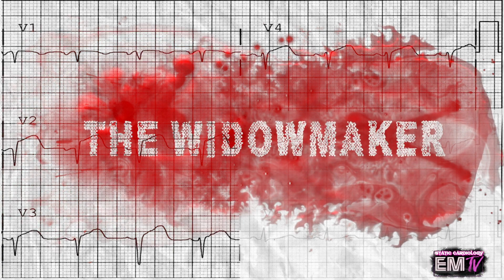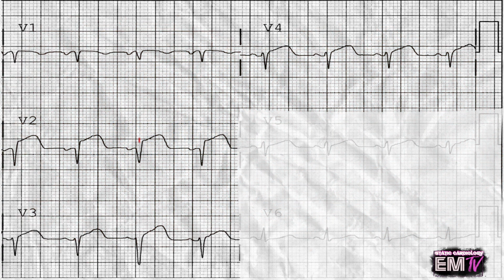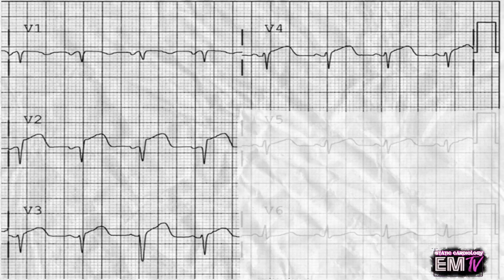In this lead grouping, I'm seeing significant ST segment elevation in multiple leads. V2, which can also be categorized as a septal lead, V3, and some in V4. I would have already met enough criteria to declare that this person is likely having an anterior MI, which is a significant medical event. Let's go ahead and take a look at the other leads.